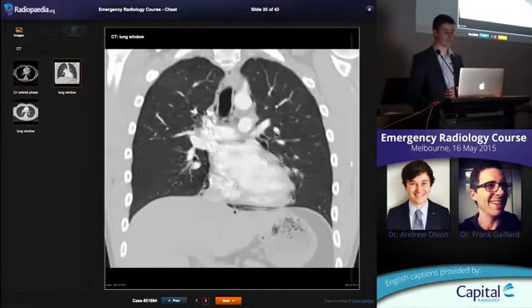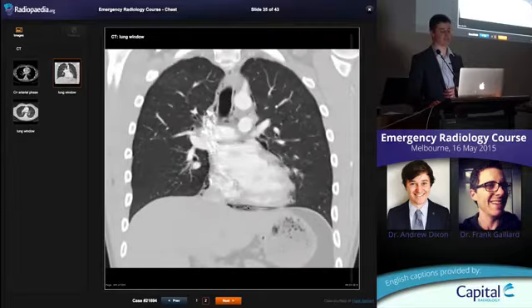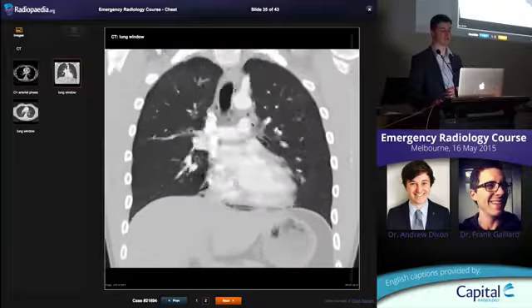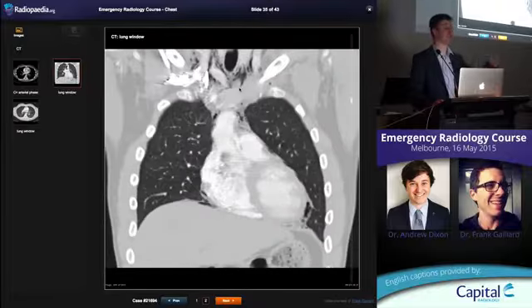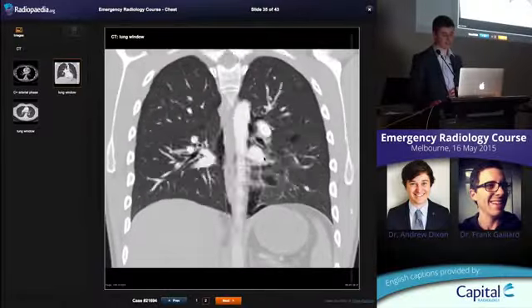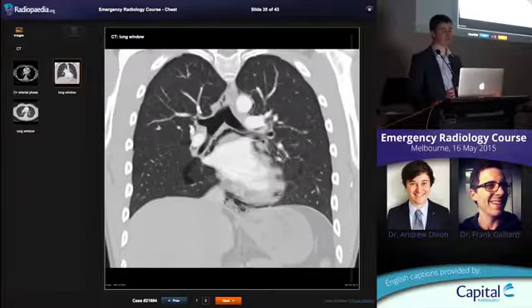Okay, but you can see the origin of that, the continuous diaphragm sign. You shouldn't be able to see the diaphragm all the way across. That's the origin of it, air sitting in the mediastinum. You can see exactly why we could see the apex of the lung, so rounded. Okay, air next to the aorta, streaky opacities, streaky lucencies going up into the neck. And it does come from this interstitial emphysema. It comes around the bronchi and tracks back up into the chest.